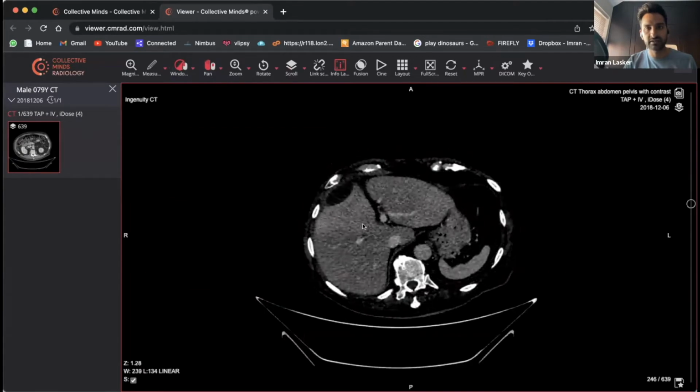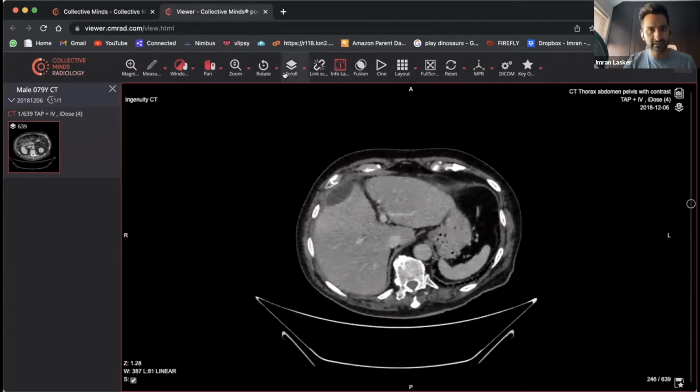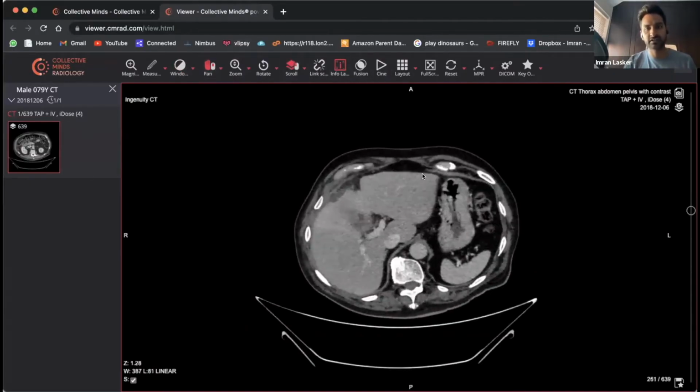And you might feel that maybe in this area here looks a little bit brighter for some reason, or that looks a bit darker, maybe a little bit brighter here. So for whatever reason, it looks like some areas have got a little bit more fat infiltration than others. So something to think about. Okay, so you may have a little bit of fat on this liver, a bit subtle, I know, but it's definitely got a bit of an enhancement difference.